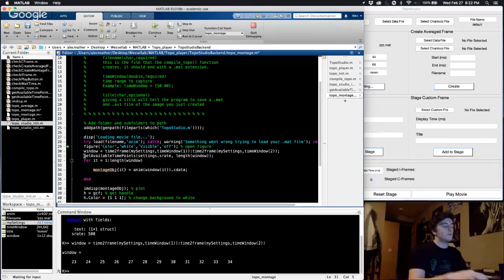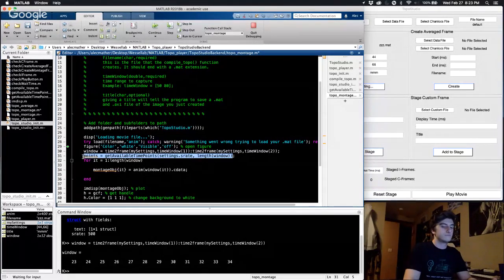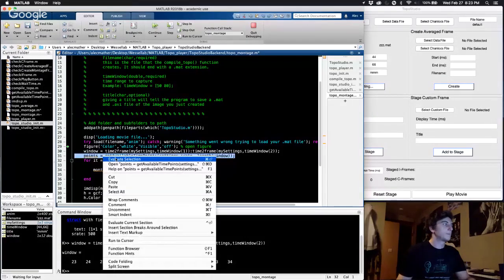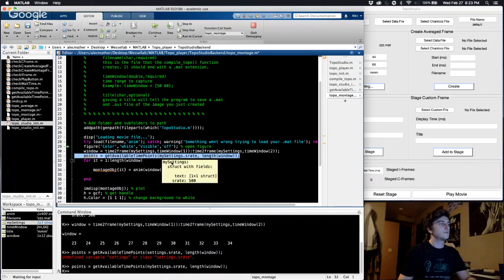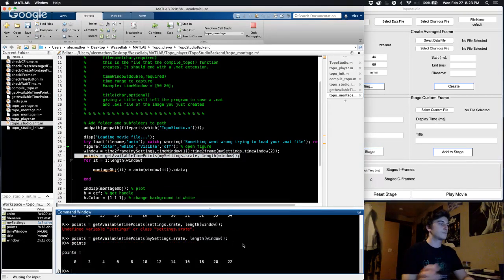We'll call this our points. Oops. Oh, this is my settings now. Okay, so that did not give us what I wanted. Damn it.